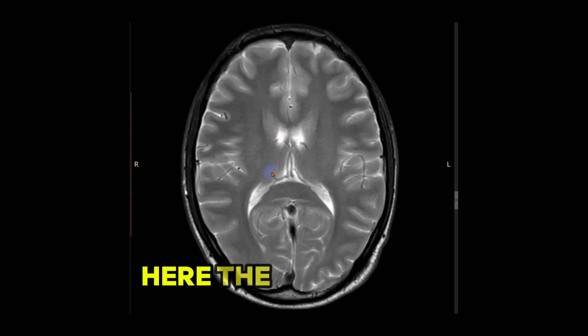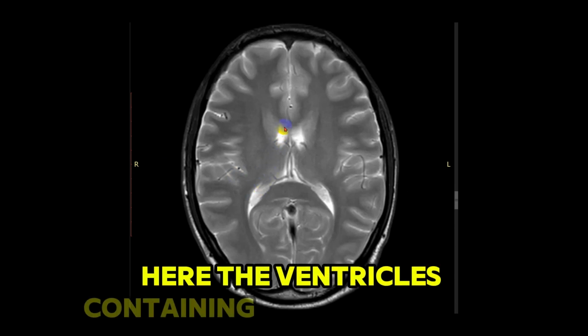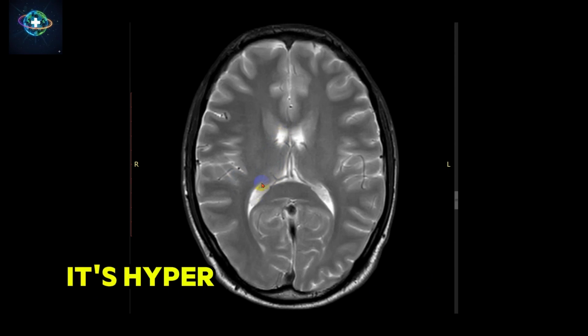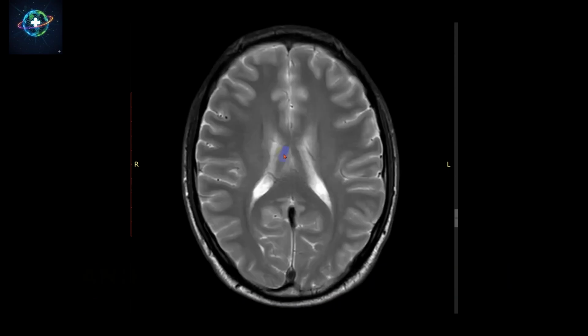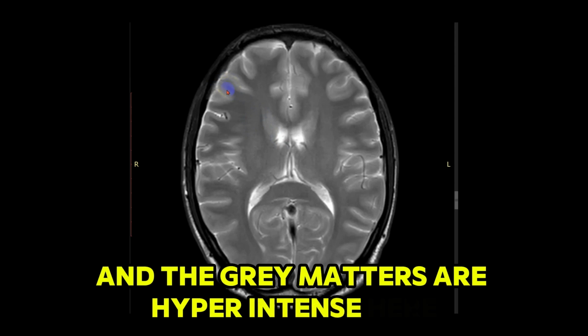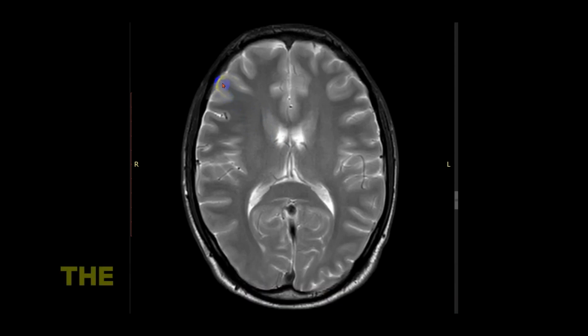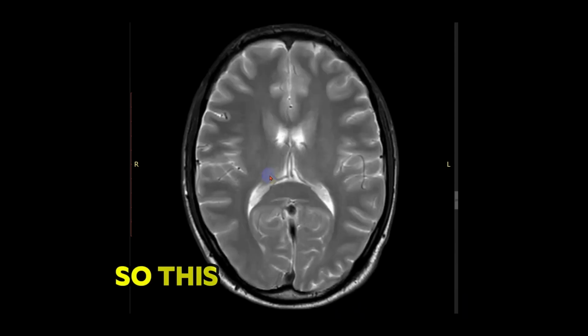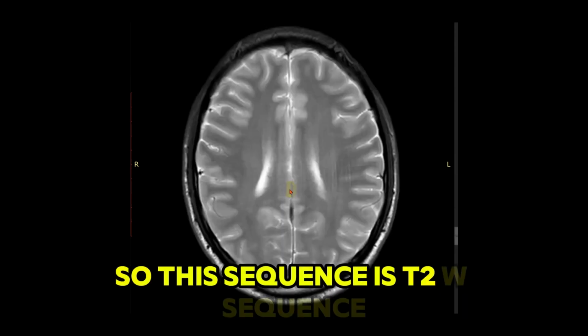Here the ventricles containing CSF, that is fluid, are hyperintense, bright here, and also the white matter is black here and the gray matter is hyperintense here. That is, the gray matter is brighter than the white matter. So this sequence is the T2-weighted sequence.